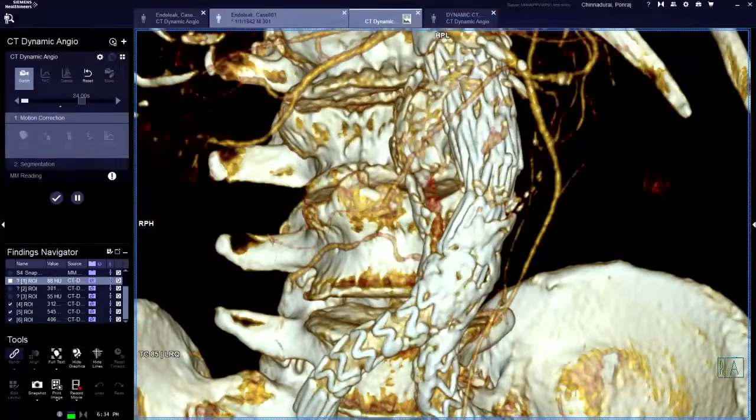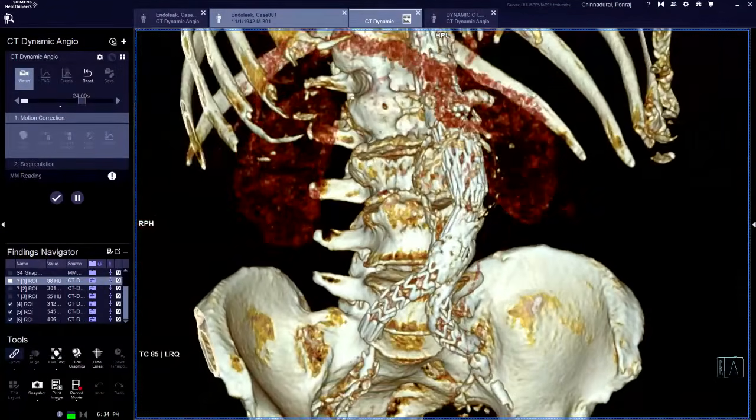Once we have this information, it all comes together in the 3-dimensional space. We looked at the raw data, and now the same process in the renderings here. If I zoom out a little, you can even see the SMV.